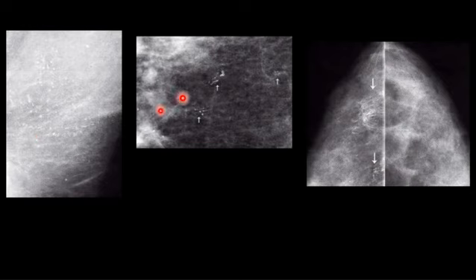Okay, this was a different patient, sorry, and there were just some water droplets on the cassette. The cassette is wet for whatever reason. Some droplets, they look like this, a very suspicious appearance. Be careful of that. Confirm that the cassette is clean and the patient's skin is clean, and there is no, for example, lotion, ointment, deodorant, tattoo, whatever, on the skin of the patient that might look like this.